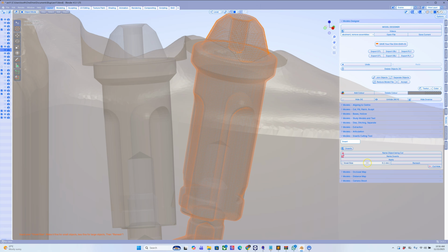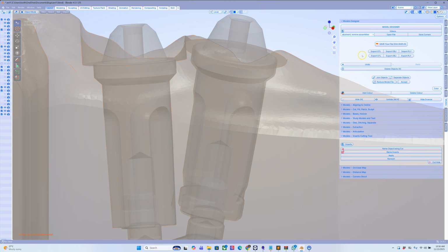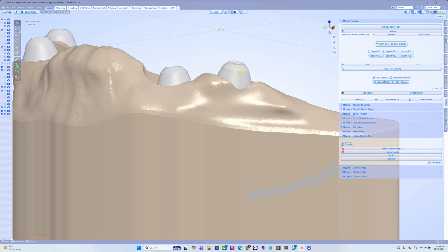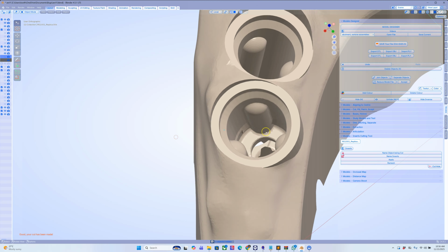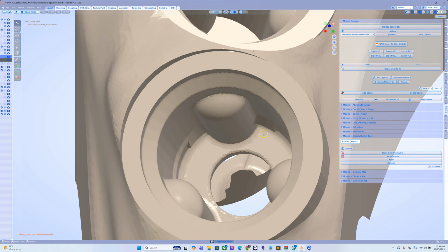We're going to voxel remesh it a little bit finer, so I'm going to put 0.05, and then we're going to remesh this cutter and then finally cut the hole. When I look at it carefully now, it has actually deleted that blockage. Okay, hide it. And now the inside has been cleared.